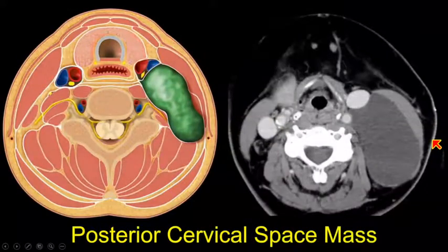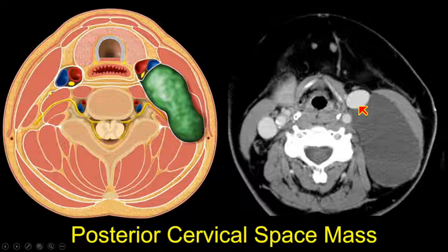And if we have a generic lesion at that level, we can see how that pushes that SCM out laterally, pushes the carotid and the jugular here anteriorly, and it's going to be out lateral to that perivertebral fascia that's around the vertebral bodies.